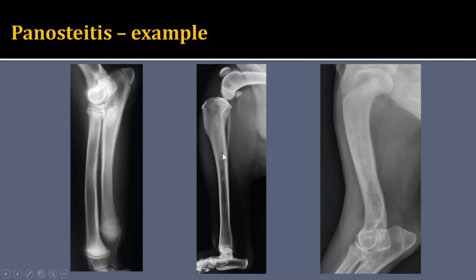And then the patient on the right has more chronic and severe Panosteitis, where almost the entirety of this medullary canal of the diaphysis of the humerus is affected with the sclerosis. And then here is a solid periosteal reaction along the caudal cortex. Again, here's our nutrient foramen.